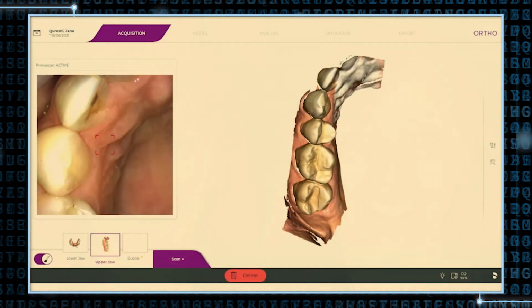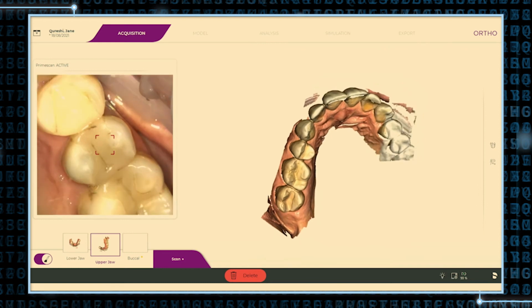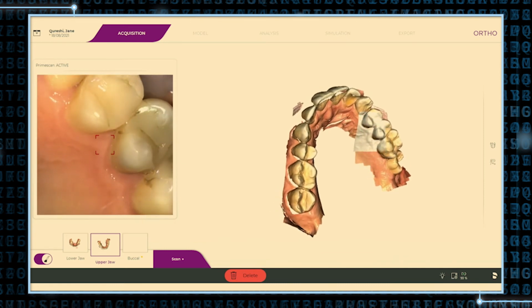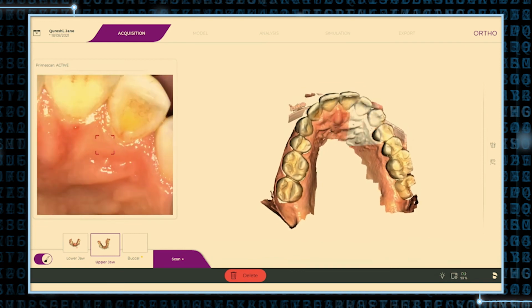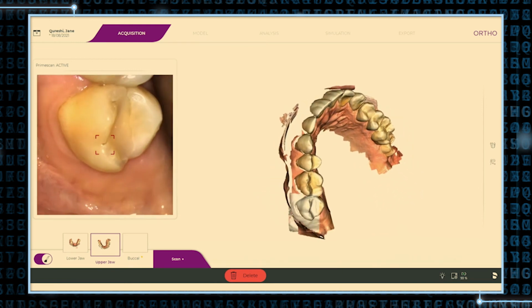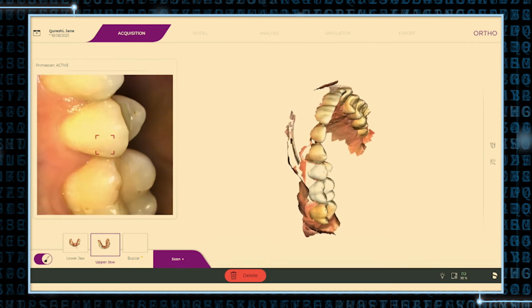And finally now, I'm going to just show you a quick scan of her retainer. This is actually taken on the first day that we got our Prime Scan, which we now have. So it's actually only one of the first scans I ever took with it. But basically, her upper retainer was made on a 3D model, obviously created by this Prime Scan recording, which was super, super easy to use and take, and actually captures images incredibly quickly without having to keep going in and out, in and out, in and out. It's just amazing how the camera works.